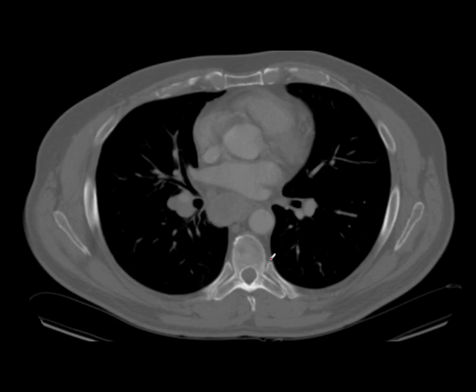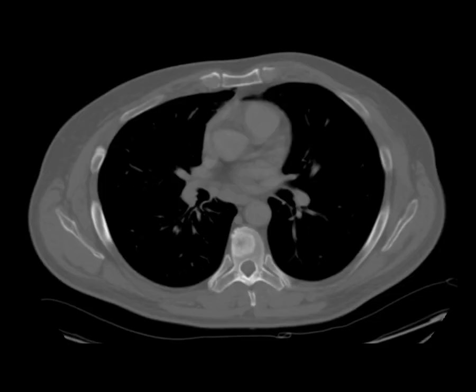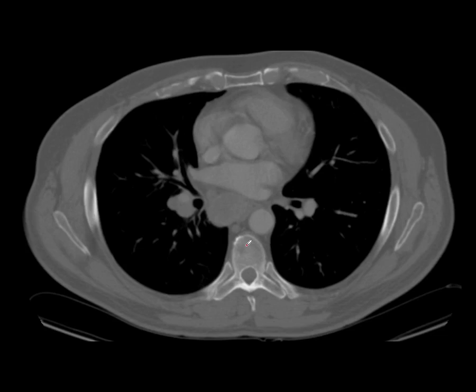The patient received treatment and came back for a post-treatment scan. We can see there's been an excellent partial response to treatment within the mediastinal lymphadenopathy. And now, when we look on bone windows, we can see a very large sclerotic lesion. But this isn't a new metastasis. This is healing of a previously largely occult little metastasis. Let's go back again and I'll see if I can convince you it's there. I'm by no means certain myself, but I think I can see a very vague lucency just in there.